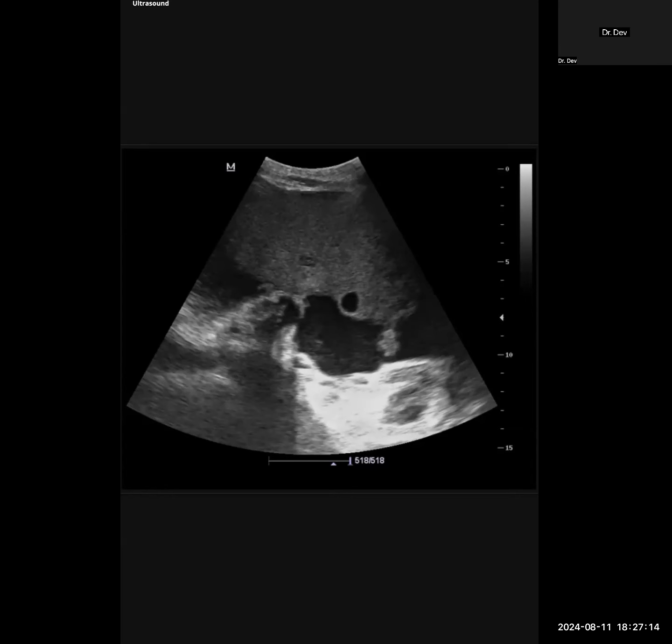So when you ask for history, what are you really looking for? Because these could also be tubo-ovarian masses of tuberculosis or any infective etiology. If the patient has any fever, it could also be. No, the patient does not. But the patient is known to the hospital. Okay.